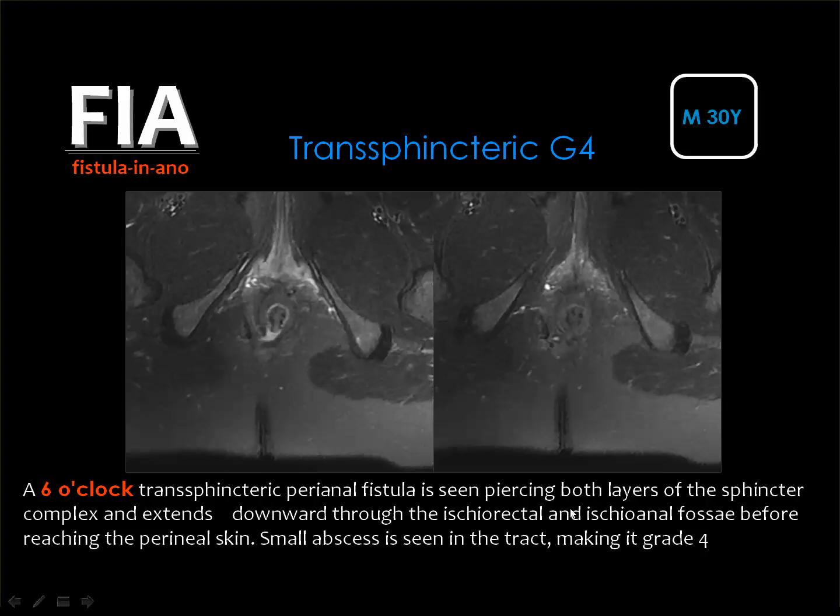Here we have an internal opening at 6 o'clock, and this is the track of the fistula going through the external sphincter.